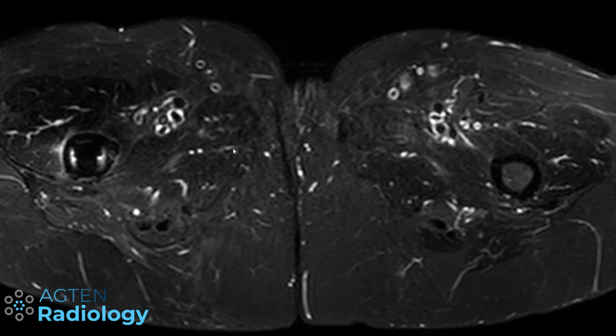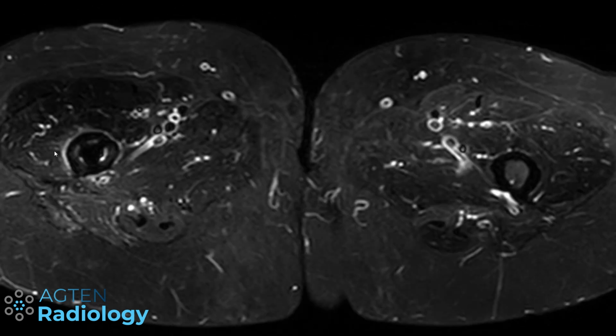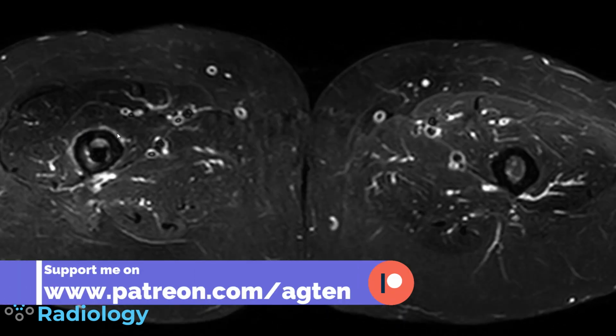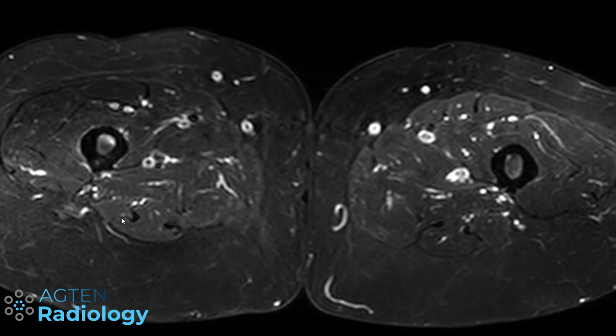If you compare both sides, you might argue, okay, potentially this is artifact, but it's not. And you can see how it goes all the way down. It doesn't have this appearance of an artifact. It's just going all the way around. I think on this image you can nicely see it here, and there's absolutely nothing on the other side.